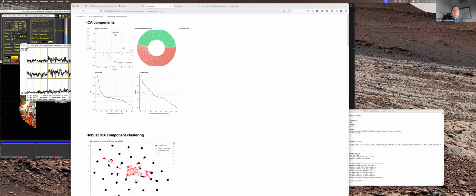I can also look here. This bottom right quadrant is values above the kappa elbow and below the rho elbow. So those are most of the ones accepted with the minimal tree.